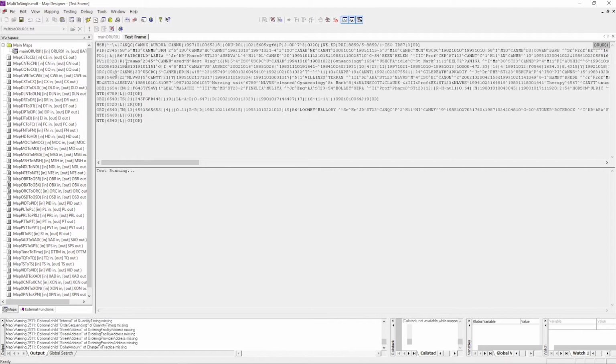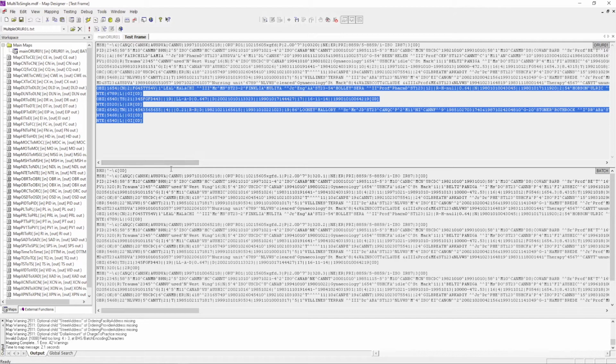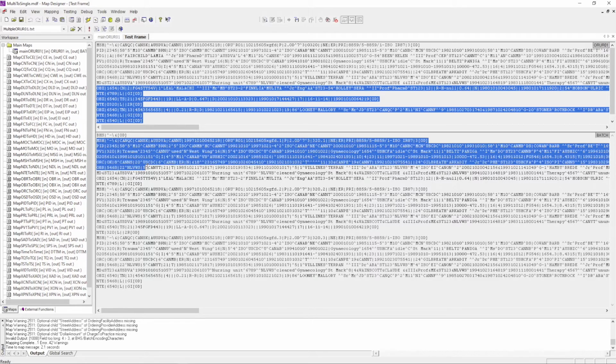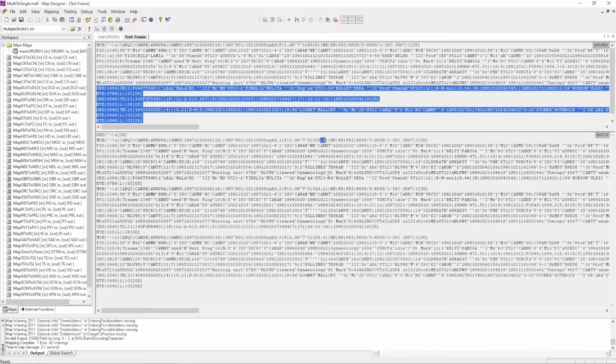We have a single message in with multiple result repeats, 1, 2, and 3. On the output, we can see we have multiple ORU R01 messages, 1, 2, and 3. All identical, bar the extra differentiator we've added to the sequence number and the message control ID.